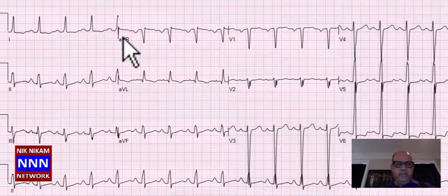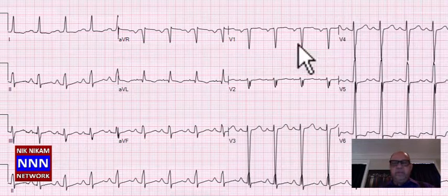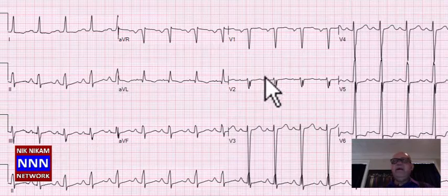All right, sinus rhythm, left atrial enlargement, increased voltage criteria, ST depression suggestive of left ventricular ischemia. So this is a grossly abnormal electrocardiogram with a normal sinus rhythm, left atrial enlargement, increased voltage suggestive of left ventricular hypertrophy with subendocardial ischemia. So these are all the findings in this electrocardiogram, and this patient definitely needs to be worked up very aggressively.